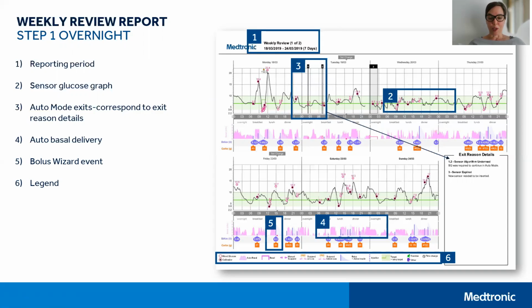Lastly, I just want to point your attention to the legend at the bottom of each of these reports so that you can see what each of these items are and familiarize yourself with everything that's going on the page.